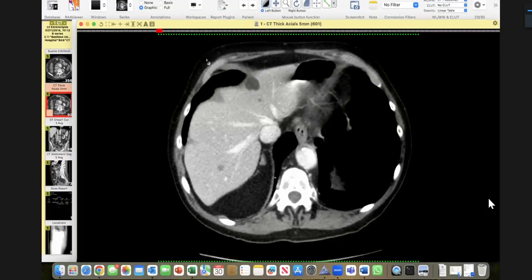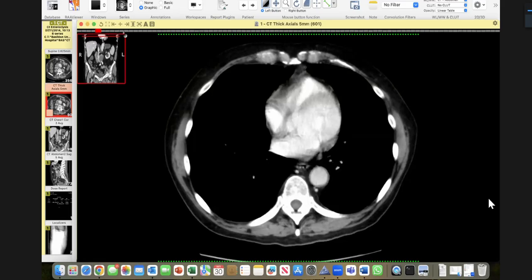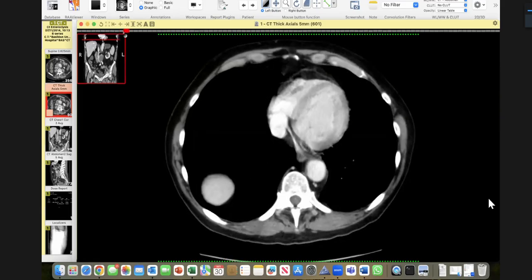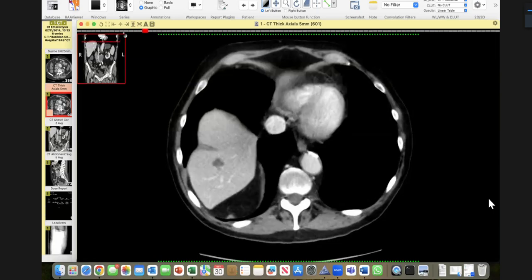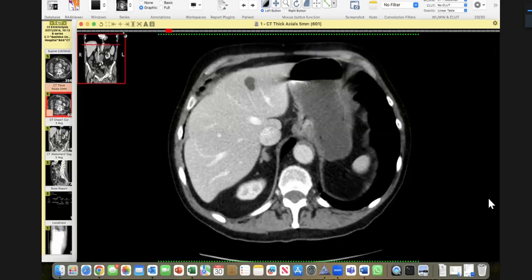Okay. This is a 68-year-old male with pain epigastrium. Over to you. Yes, sir, I am able to scroll. So, a 68-year-old male patient with abdominal pain. I've been provided with post-contrast CT abdomen, including lung bases. In my initial scroll, I can appreciate few fluid density, simple thin-walled hepatic cysts.